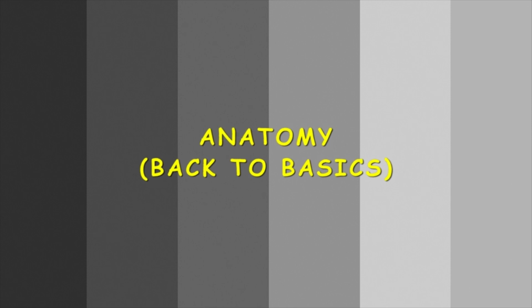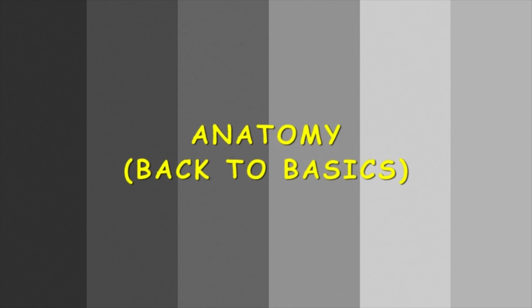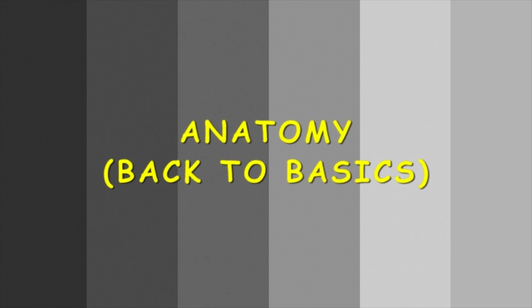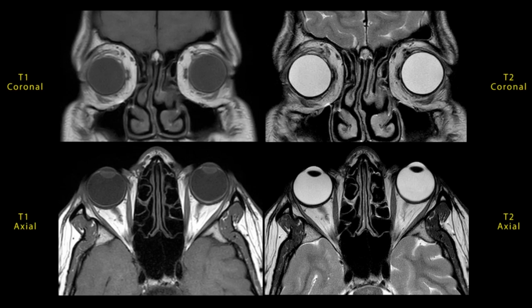Before the detailed analysis of pathologies, it is essential to understand the basic anatomy of the orbital structures and their visualization on MRI scans. Orbital tissue characteristics on MRI of major structures in the orbit are as follows. Aqueous, vitreous, and CSF look hypo-intense on T1 and hyper-intense on T2. Lens shows intermediate signal intensity on T1 and T2. Sclera, choroid, and retina, all the coats appear as one, with intermediate signal on T1 and hypo-intense on T2.